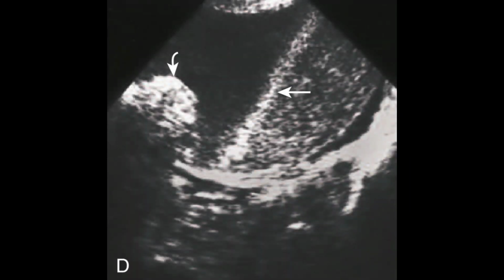Look at this transvaginal image, and on this image you can appreciate two particular radiological patterns which are identical for the dermoid lesion. The first one is called the hair fluid level. This, which is indicated by the long arrow, is the hair fluid level. This particular pattern is called a reticular pattern.